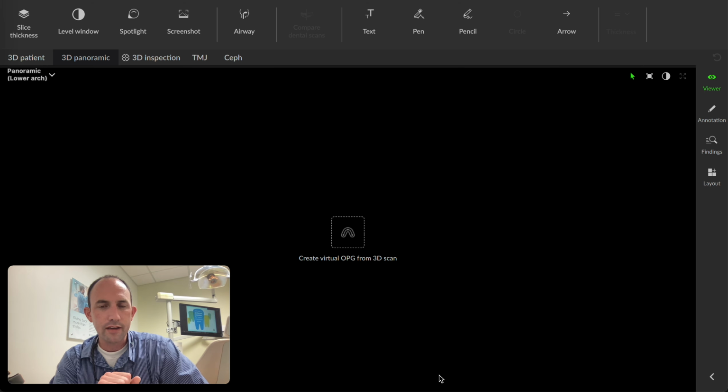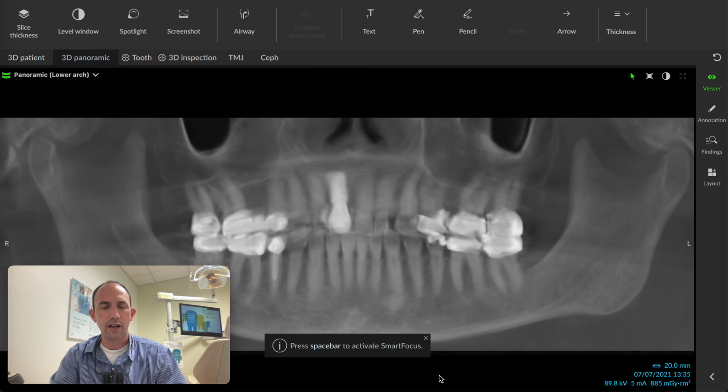So let's go next, and here's your 3D image. Now we get a lot of questions. I get emails and phone calls and texts about, this is so grainy, what can I do about it to increase it? Well, just like in the previous video, how I made things smoother, in this particular image set, you're going to want to process this a little bit.